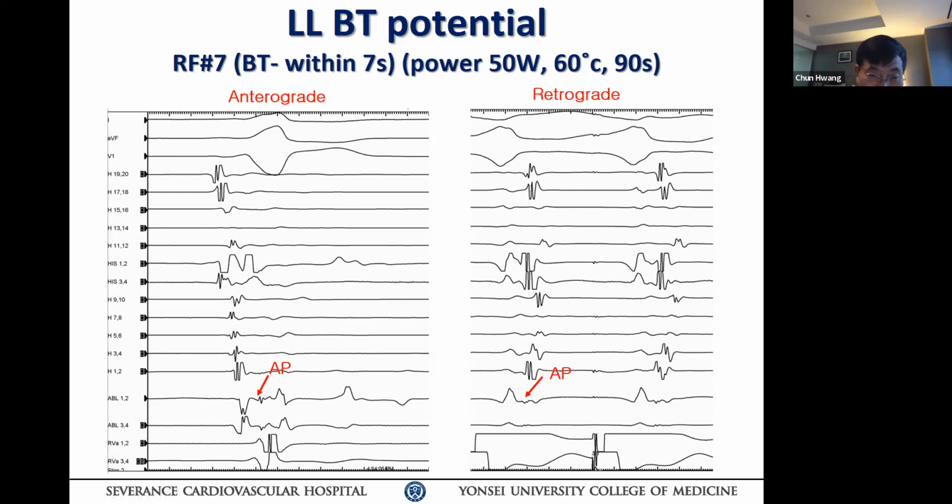Yes, I can believe you, but not in the antidromic pre-excitation. Absolutely not a chance. There's something else you're looking at. Could it be an accessory pathway? May not be. But looking at your trace, EGM, okay?